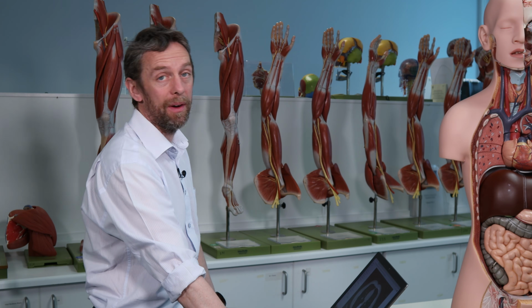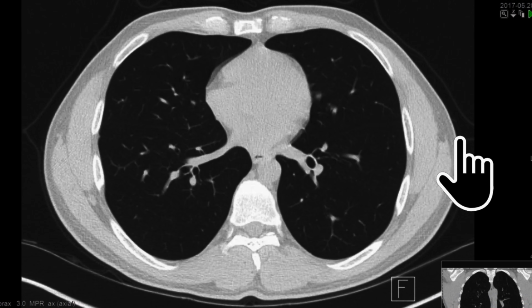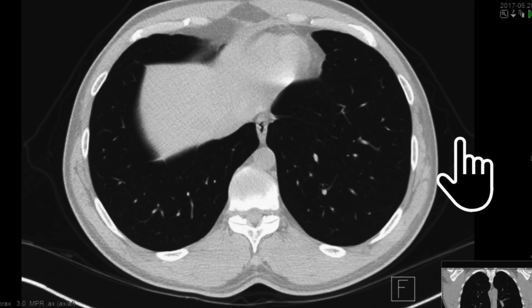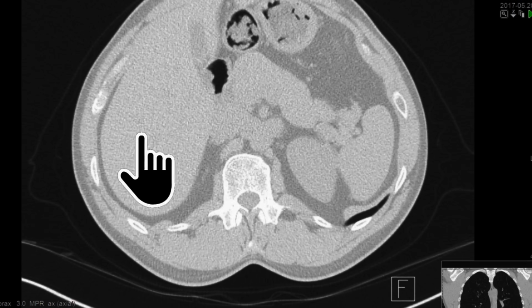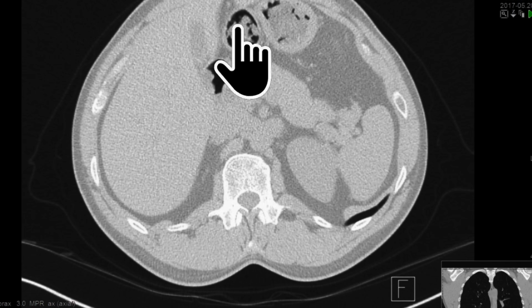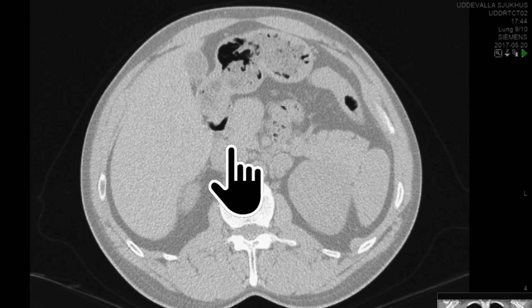The last thing we wanted to find was the inferior vena cava. So if I scroll down, if I go all the way down to the diaphragm, there we go. Go through the diaphragm, certainly a little bit anyway. This is the right side, so this is the liver. And we're starting to see some other structures of the abdomen here, which we'll do another time in a different video. But follow the liver up here.